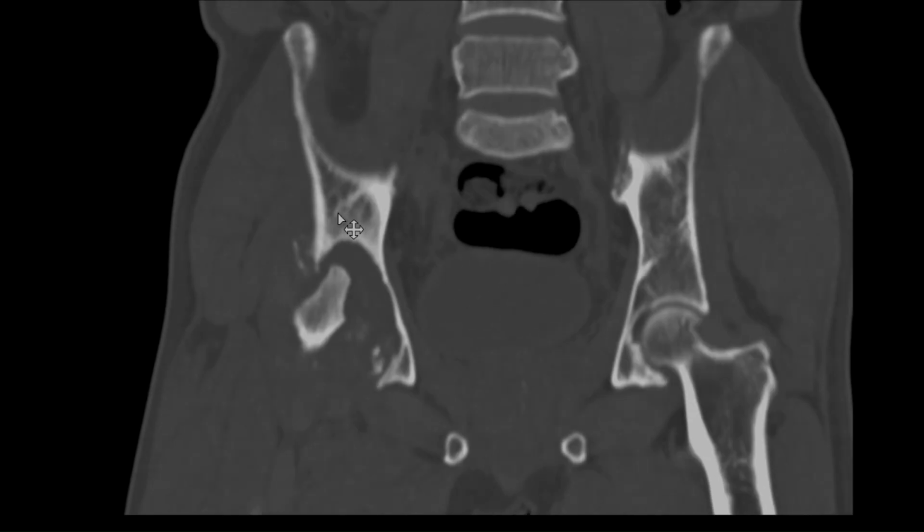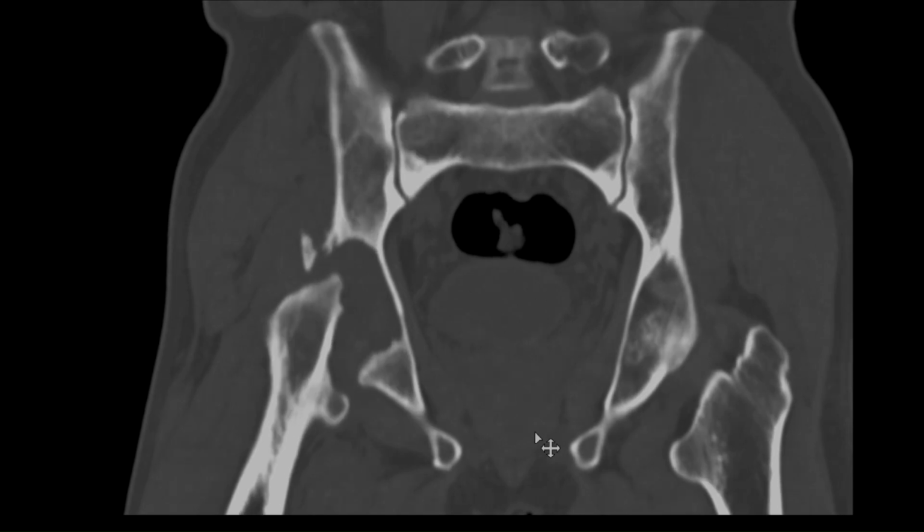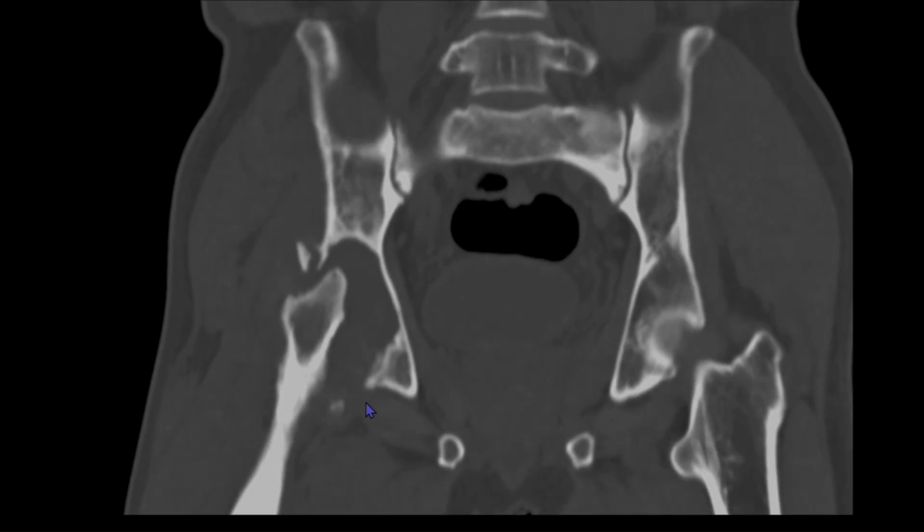One more thing that the clinicians, the orthopedicians, need is the limb length discrepancy. So we should also give in our report the shortening of the limb on one side compared to the contralateral aspect. This is given with respect to some solid base. In this case, we are putting a horizontal line through the lesser trochanter on the left side, and we'll see how superiorly migrated the right-sided lesser trochanter is. So this is about 2.2 centimeters. This is how shortened the right limb is.